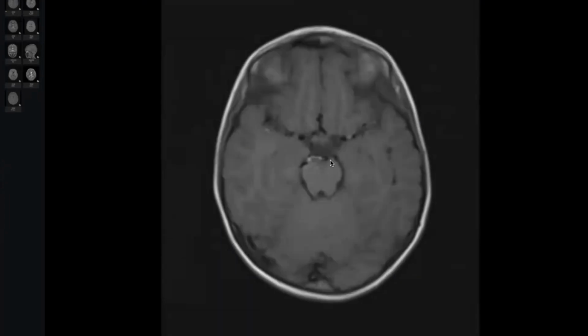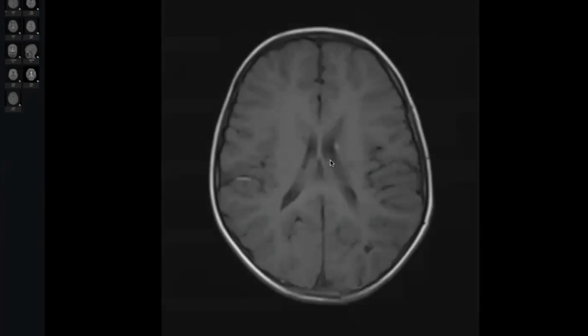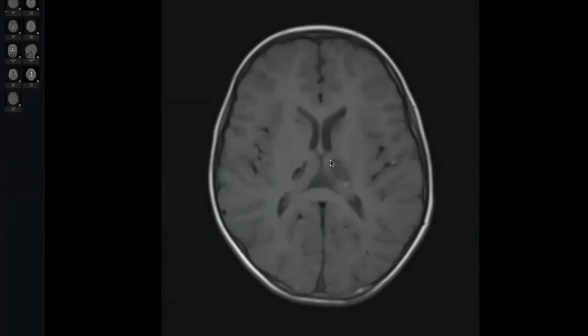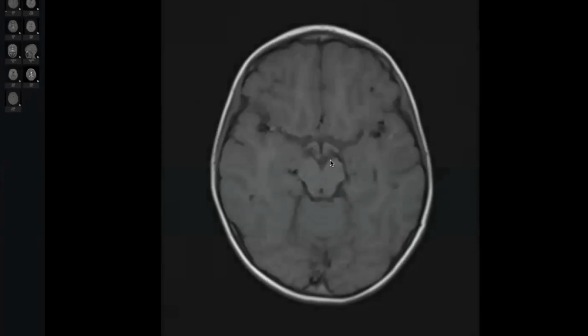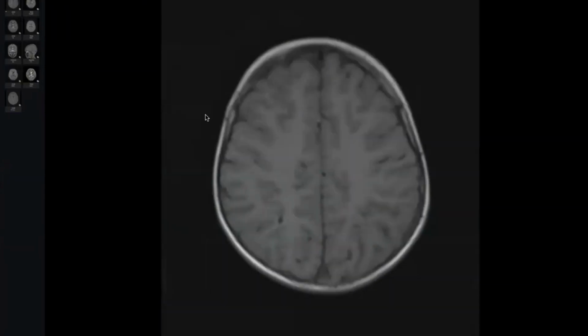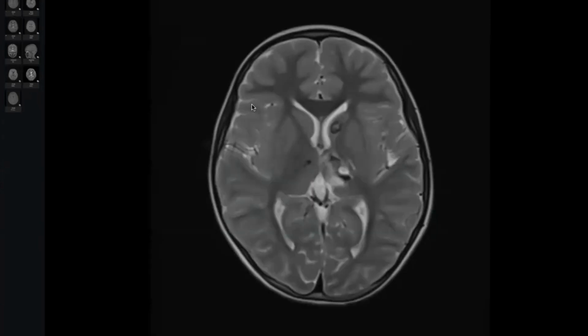Could be hemorrhage. Excellent. Multiple hemorrhage in a young age. Multiple focal hemorrhages, non-territorial, not related to a specific distribution, and give a very characteristic appearance here. This, by the way, is a very characteristic appearance for a specific disease.